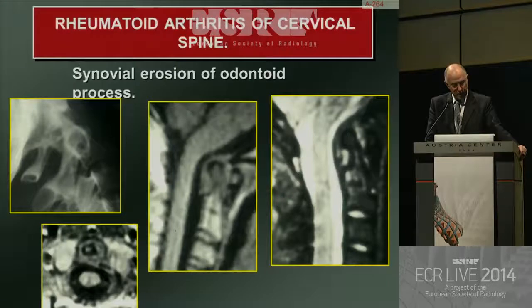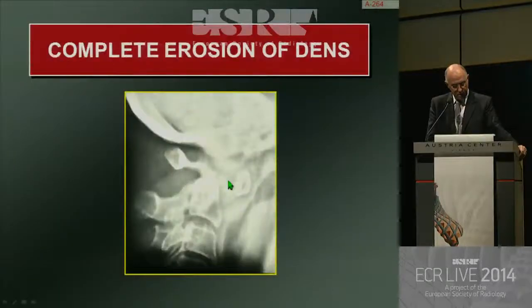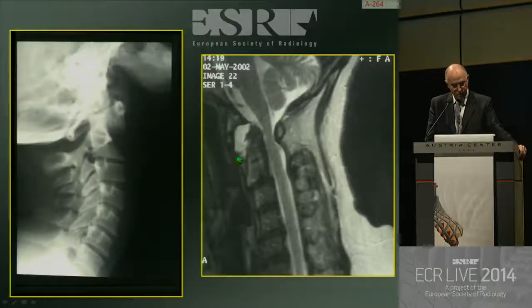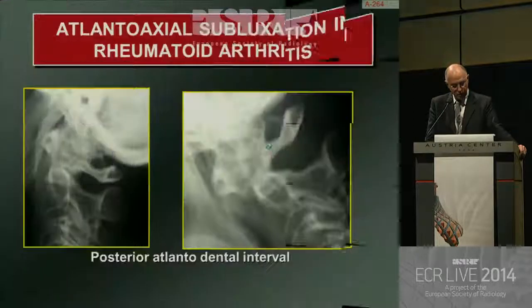Rheumatoid arthritis of the cervical spine is more or less the same thing, by having erosive disease on the odontoid peg, as you can see on MR. And the peg can be completely destroyed, but apart from destruction of bone, because of the hyperemia, you also get ligamentous laxity, and this is quite important, not so much because of your identification of it by noting the atlantodens interval increase, but very importantly, as I'll show you in a moment, but I'll start with the MR, the compromise to the cord at the back.